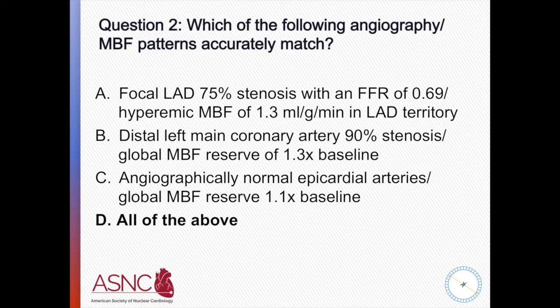Right. I usually think when I see numbers that are that low, 1.1, that that's a likely etiology, and before making other management decisions that may place a patient at potential risk, such as proceeding directly to coronary angiography, we'll often retest the patient, perhaps off caffeine for 48 hours or with a different agent such as dobutamine. Okay, very interesting case and good discussion.